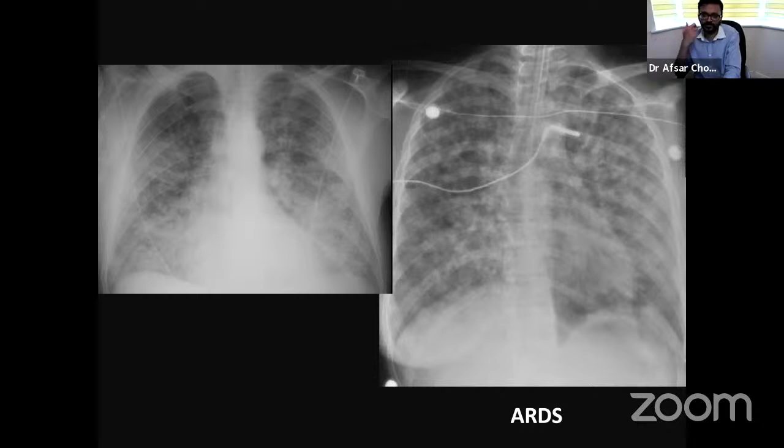Initially the patient's oxygenation can be bad, still you may not see much in the chest X-ray, but changes are already there at the interstitial level, and eventually you will start seeing lung changes. And even this patient can show good improvement, but the lung changes take time to resolve. That doesn't follow the patient's symptoms in ARDS.